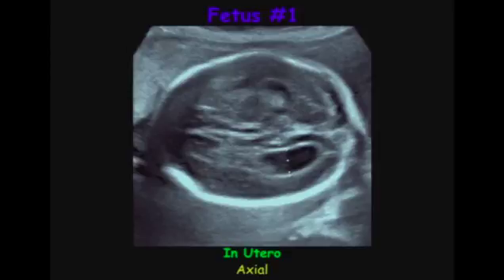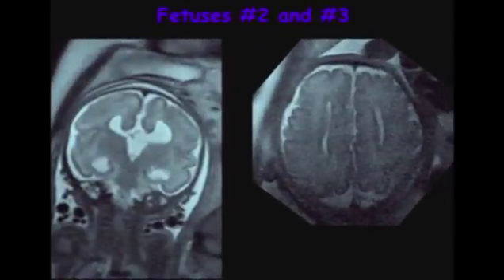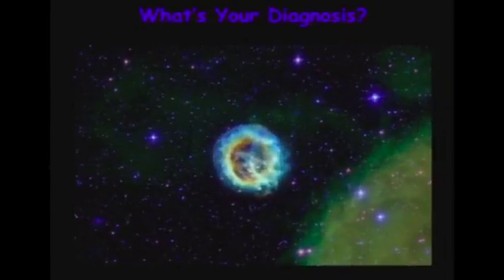Okay, now let's get on to something more interesting. Here's one fetus, axial view through the ventricles. Here's fetus number 2, a coronal view through the head. And here's fetus number 3, an axial view through the head. Both of these are obviously MRs. What's your diagnosis in all 3 of these fetuses?